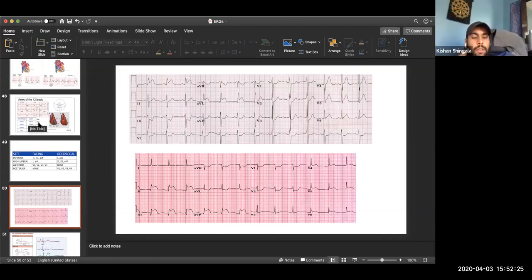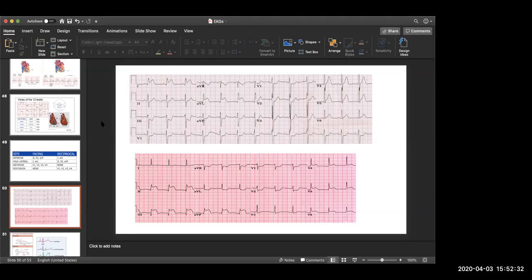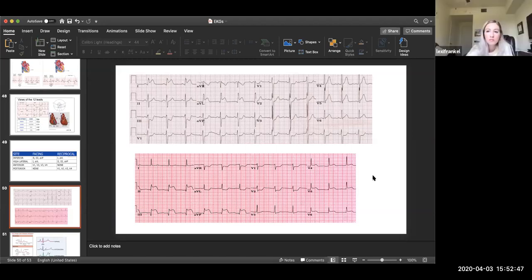Yeah, aren't V5 and V6 also elevated? So it's like a lateral inferior infarct. Yeah, but I don't think there are as much as 2, 3. 2, 3, AVF are really elevated. That'll still be the posterior descending artery. Kind of anything from the back is going to be PDA, even if it's to the left or to the right.